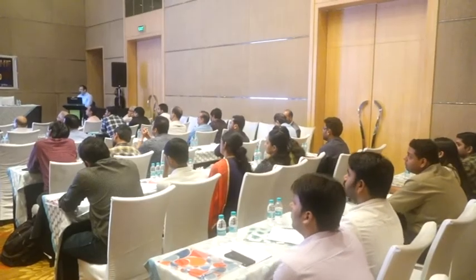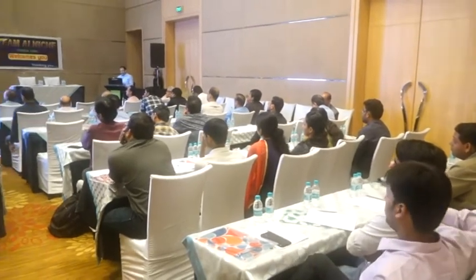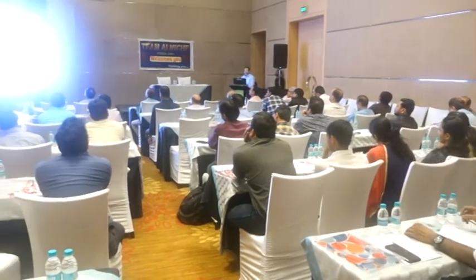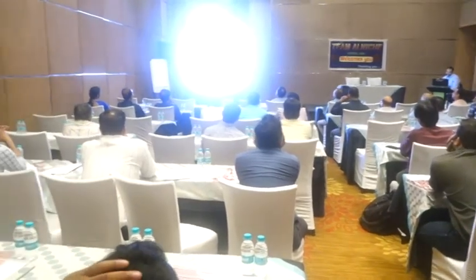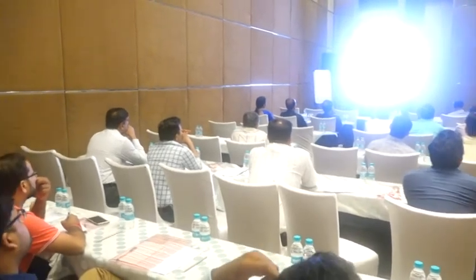The approach is always the same, like the approach for reading a chest X-ray, CT chest, or CT abdomen. You always have to review the full patient history and examine the patient before reading any CT film. So check that the patient characteristics match those of your patient. We can miss things, like the windows we have seen here.